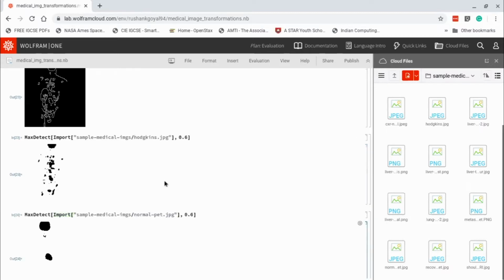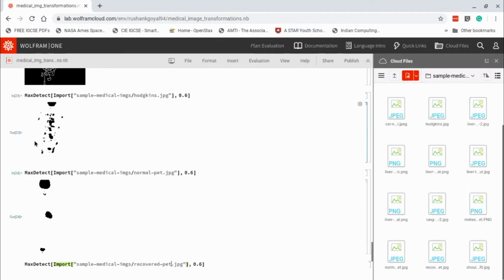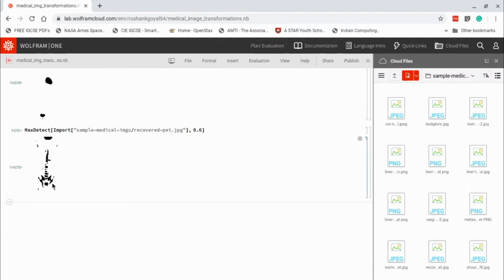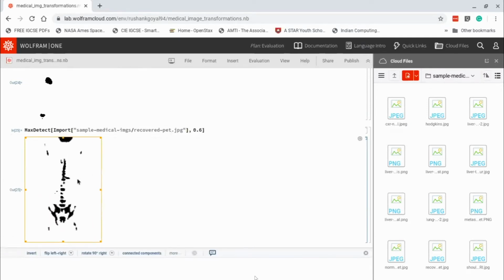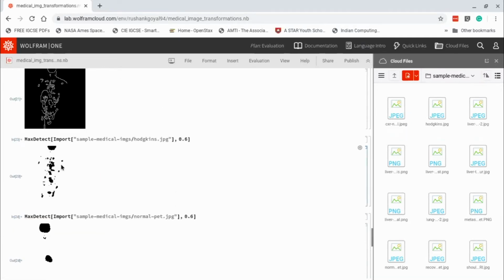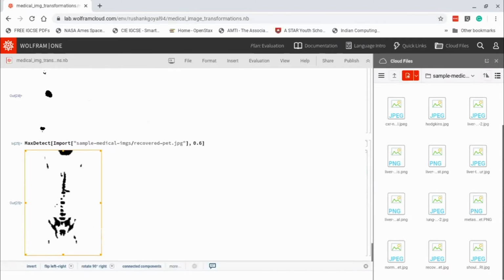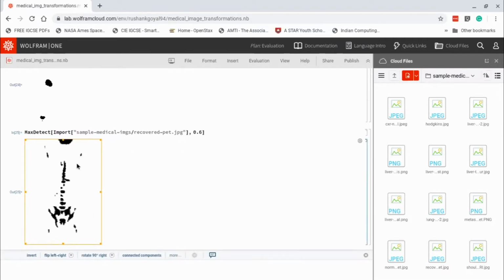So this patient, I also have another image of the same patient. They were diagnosed with lymphoma, and then the doctors gave them antibiotics too, and they used chemotherapy to help them recover a bit. After 2 rounds of treatment, they took a PET scan again. And as you can see, this one's different because in the first one they had hypermetabolic lymph nodes all over their body, and in this one it's changed and it's only around here, because that's what chemotherapy does.